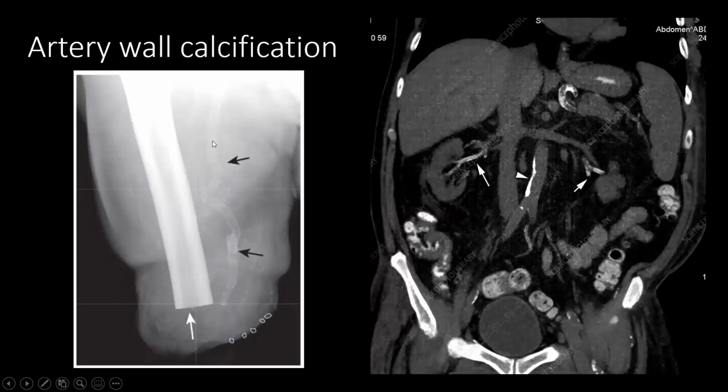So this is a femur, and as you can see here, we have a vessel disease. And as I told you, since it's a tubular structure, this vessel is undergoing a calcification that is linear. So this linear calcification here is indicative of severe atherosclerosis. And here you can see the surgical clips. These surgical clips are after the surgery, so they are indicative of the surgery that has happened.